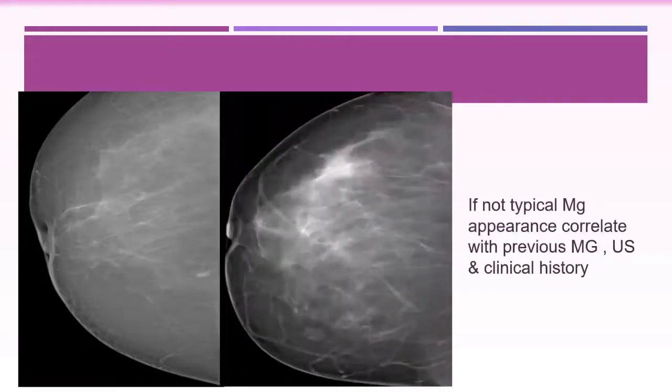If you look at it and you see some thickening and retraction, and you couldn't see any distortion, asymmetry, masses, or suspicious calcification, and you are not sure, you see an opacity far away here, a tubular opacity, and you don't know what is going on, you just have to check the previous images. If it is stable, seen in the previous, that means this is sequelae of ductectasia, full stop. Plus BI-RADS 2.